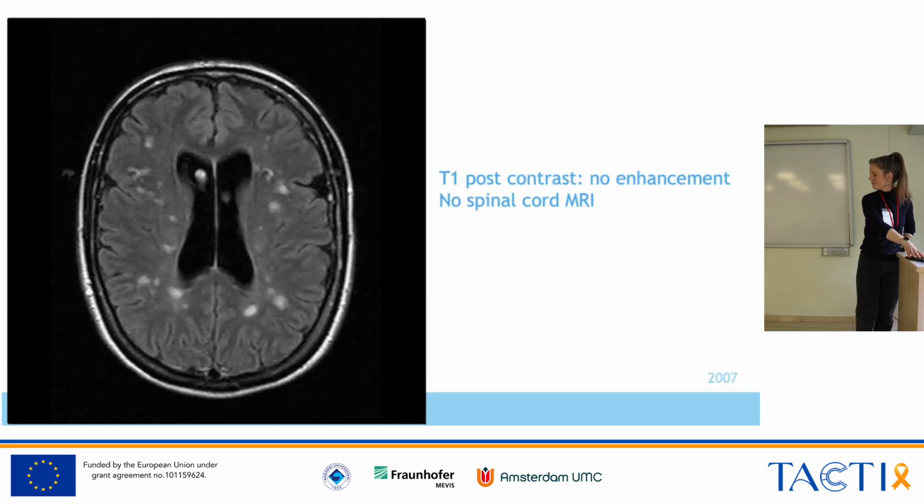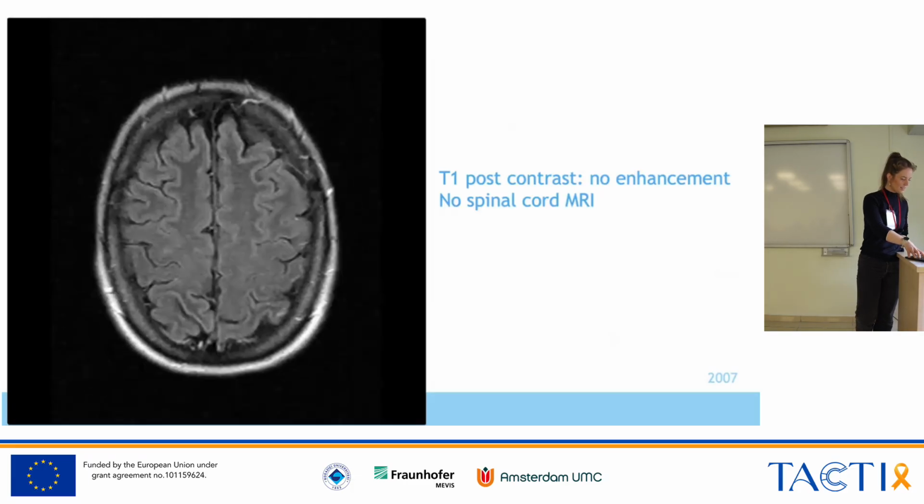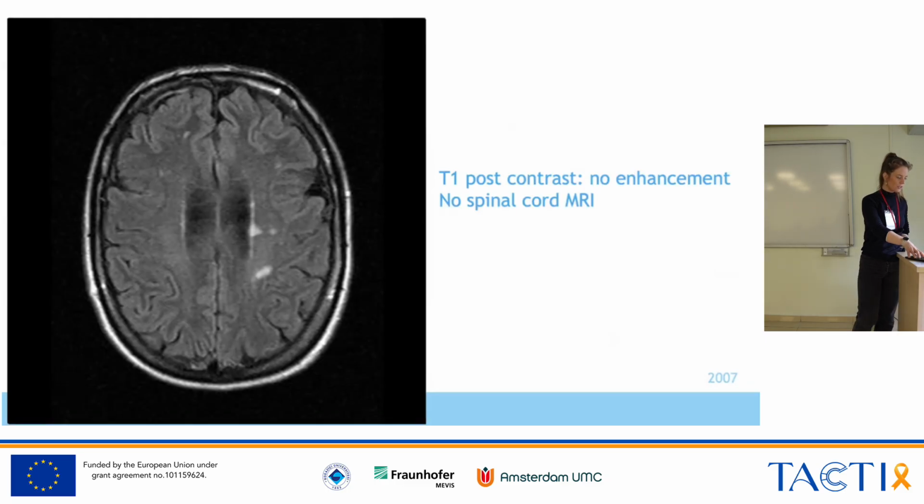That being said, she also has a suspicious clinic. I would love to see the eye also. Do we have eye evidence? I think, no, we don't have that. No. Back in the old days. But currently I would say that it might be mixed pathology.